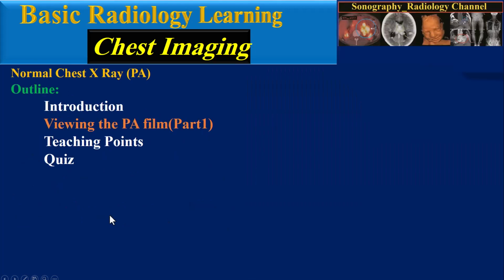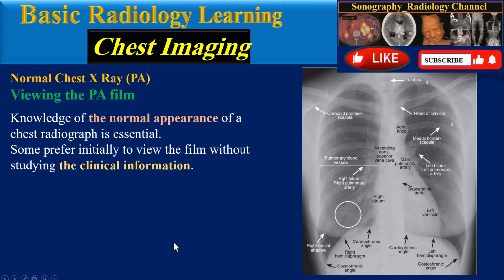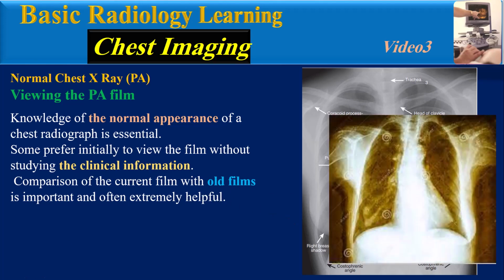Viewing the PA film. Knowledge of the normal appearance of a chest radiograph is essential. Some prefer initially to view the film without studying the clinical information. Comparison of the current film with old films is important and often extremely helpful.